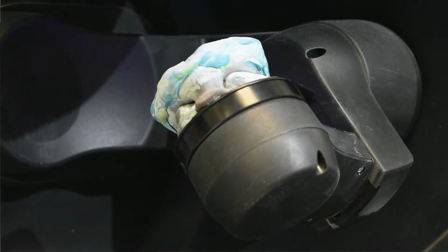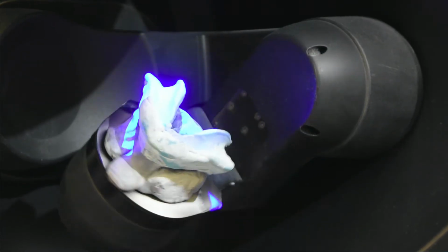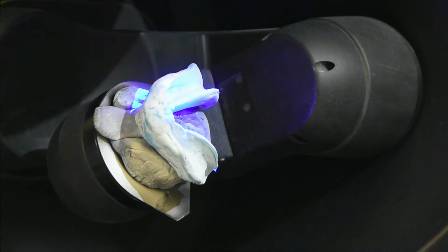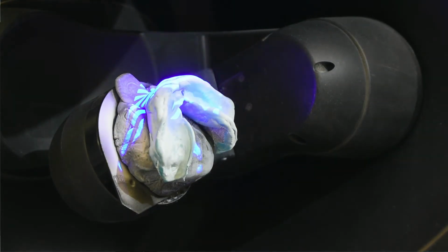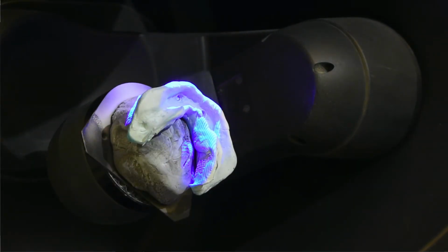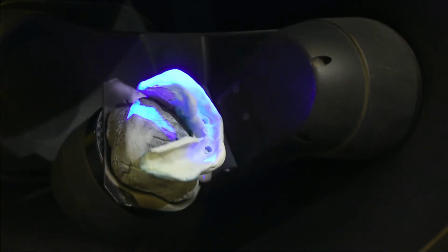Now, had I selected capture area to do this, it would work until it fills everything in. However, the file is going to be very large. It's going to take a while to do it, but if you want the whole thing to be automated and walk away, you can do it. Select capture area, select the whole area, the whole impression to be done in high definition, press go and go do something else, come back.